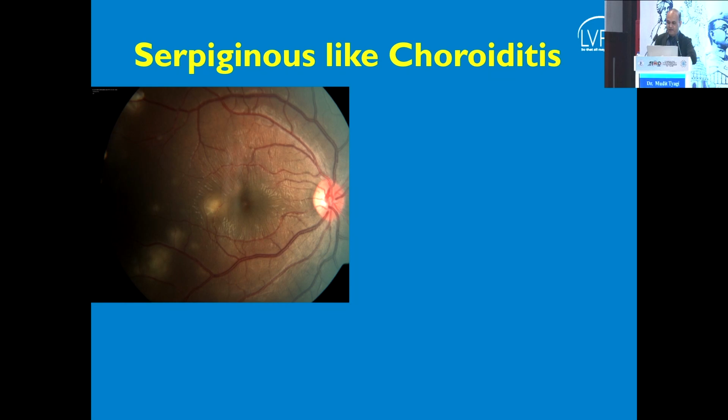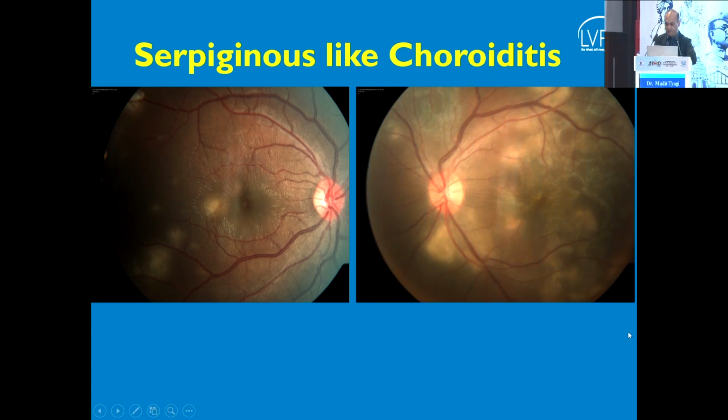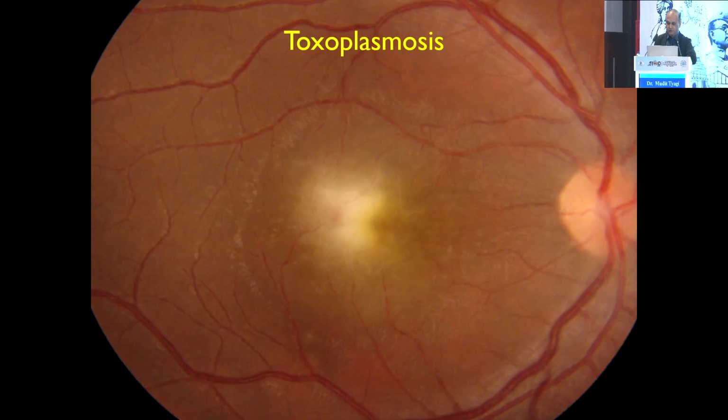Serpiginous-like choroiditis, a very common pattern which we have come to learn a lot about, and we will be talking about this in the subsequent slides, so I will skip that. But if you see lesions over here not involving the disc area and you can see pigment clumping over here, think of serpiginous-like choroiditis as one of your differentials, and again that points to an underlying TB as a cause.